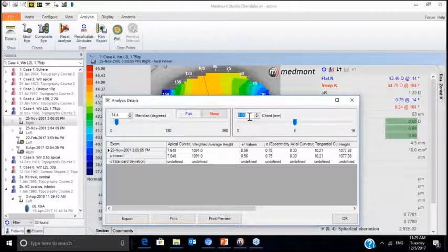Now, if you do orthokeratology, if that's one of the treatments that you have in your practice, then you might ask, is this a patient that would be a good candidate for an orthokeratology lens? Or if I was interested in fitting this patient in a multifocal rigid contact lens, would this be a good candidate? Do we have good opportunity to fit this patient with a symmetric lens, or is this eye relatively toric and we would need a toric type lens or a toric periphery?